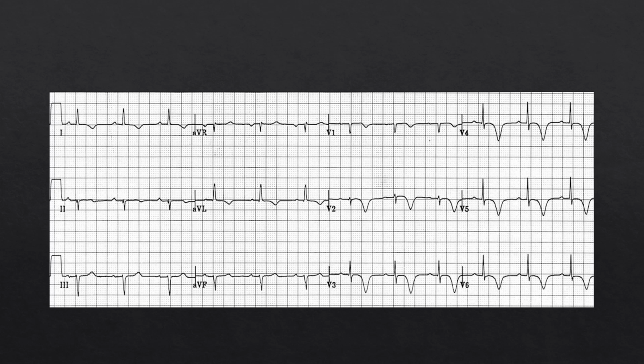That's a reperfusion pattern and indicative of Wellens. If this was a patient that had suffered a significant head injury, and you saw these T waves, that would make these cerebral T waves, and I would be more concerned about increased intracranial pressure at that point. Obviously, the patient has to match the ECG to make the diagnosis.